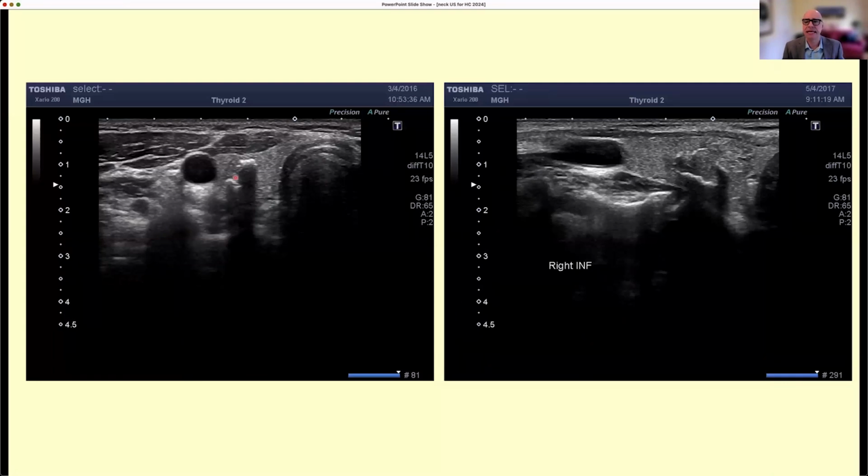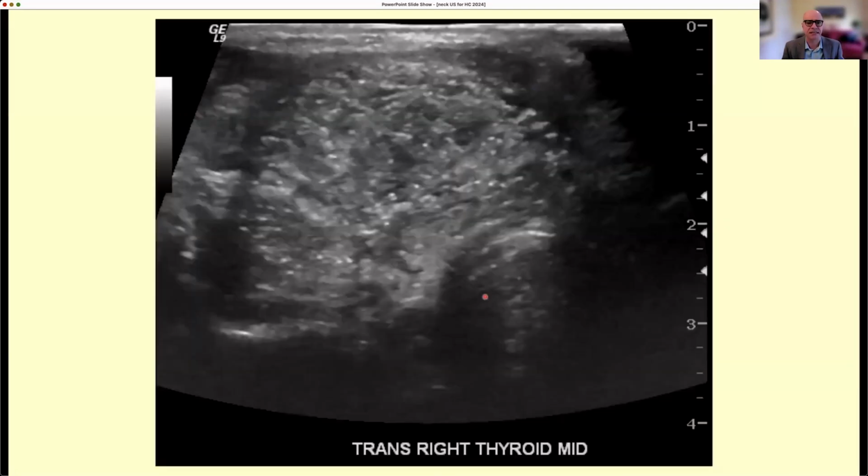There are sometimes linear calcifications that are not associated with a nodule. And those are, again, very typical, a linear calcification. And then you can see the shadow behind. I don't know what these mean, but if they're not associated with a nodule, you don't have to worry about that. And sometimes they look like this. Because calcifications can occur after hemorrhages, I think this may be related to neck trauma somehow, but it's my theory, and don't quote me on that. But they don't necessarily represent a concern for malignancy if they're isolated.